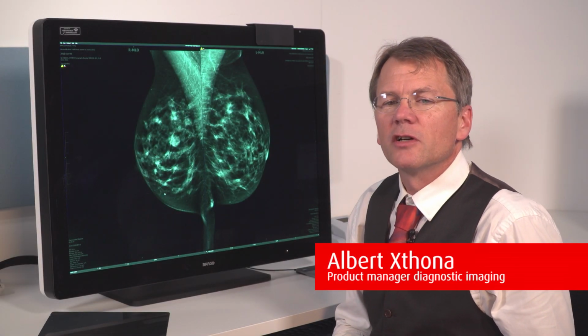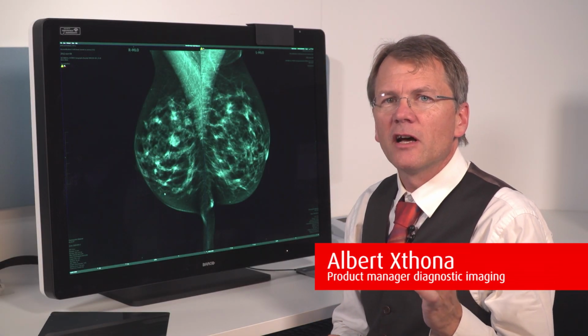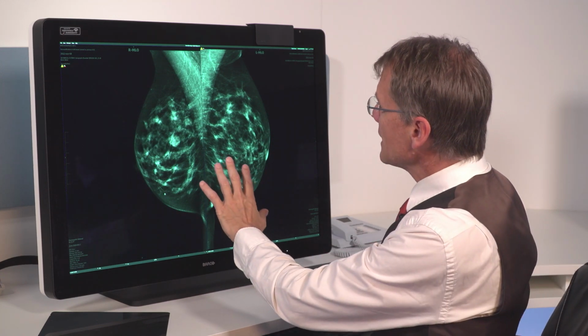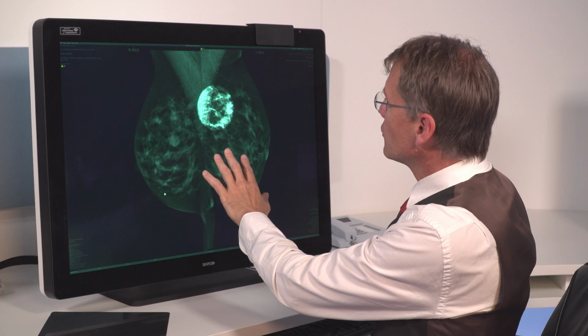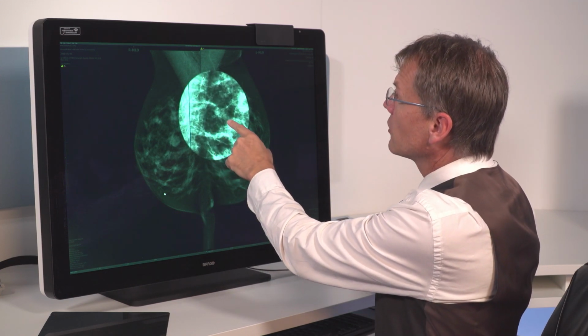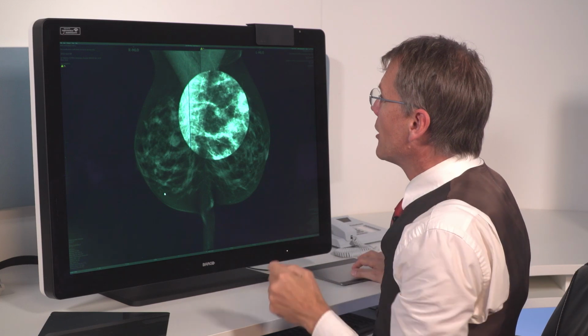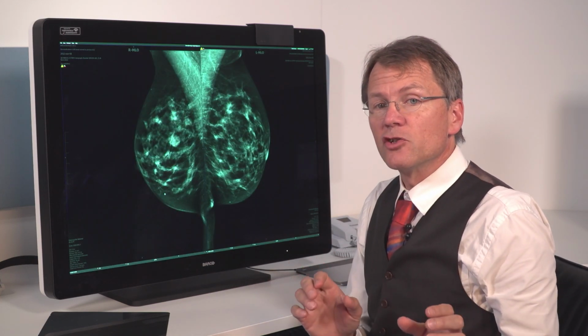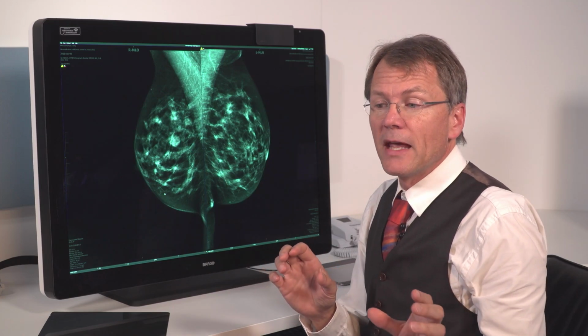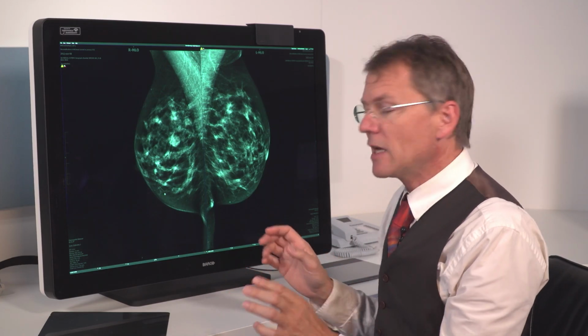The SpotView feature is designed to help radiologists see details more clearly. And so in a case like this, it's useful to be able to see the calcium. It can also, with the tap of a finger, magnify that up. But we've added some new features, the SpotView Align and the SpotView V mode. And so I want to show you how to enable those.